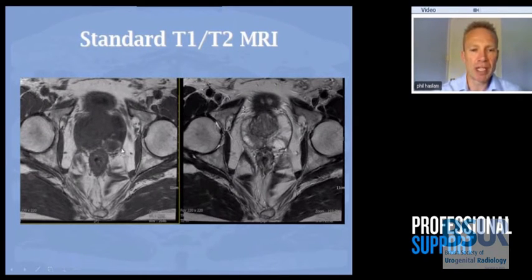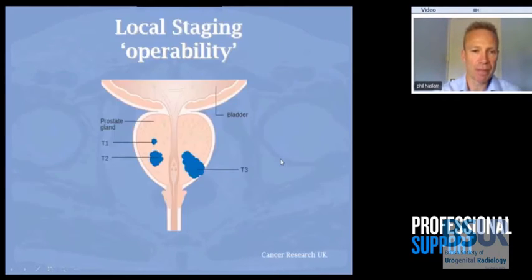This is a T1 weighted scan. This patient's already had a biopsy, and that gives these areas of artifact which are high signal on T1. When you go to the same slice on T2, you can see these appear low signal. Tumour also appears as low signal. So this can actually be quite confusing and could lead to a false positive if you don't realise on a T1 weighted scan that this is actually due to post-biopsy hemorrhage.